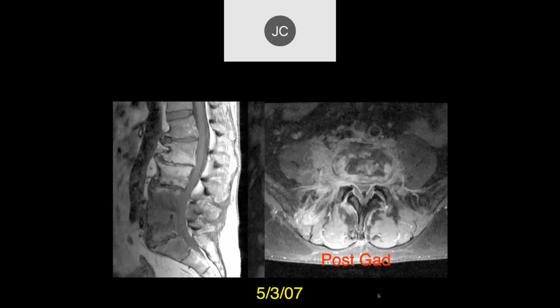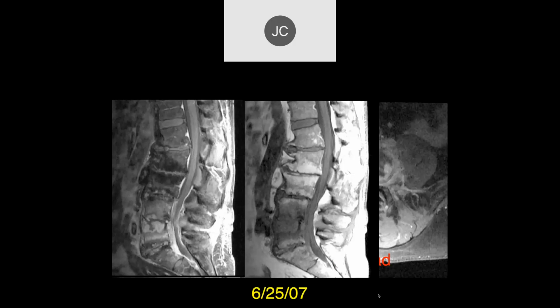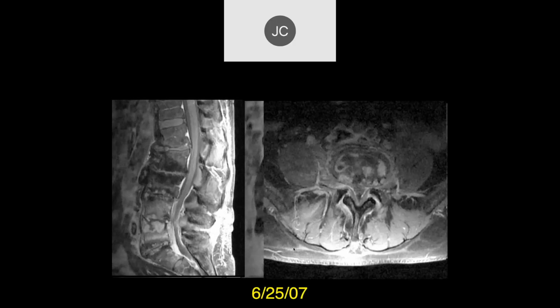So what's going on? Thinking that's some kind of infection. I think the sacrum is involved too. Yeah, okay. Some kind of infiltrating infection, but not exactly sure what's going on. There's no abscess or any extradural lesion. So here we can see a lot of degenerative disease, but the real concern is at 4 and 5. Yeah. And right, this was a Staph aureus infection.